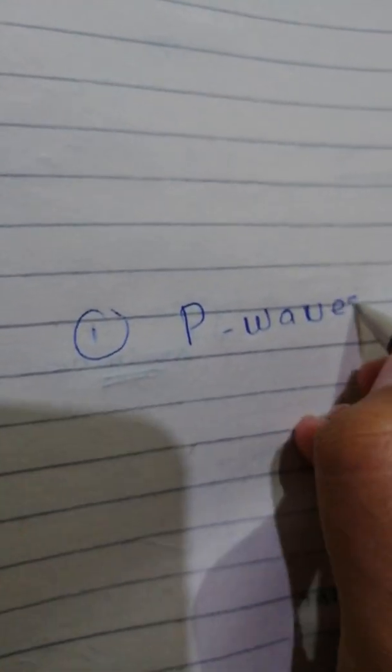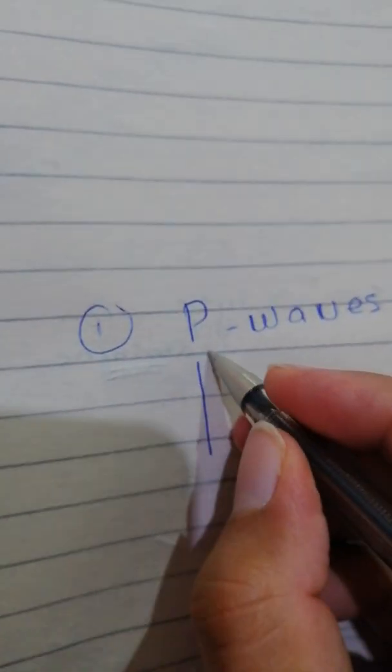Additionally, what you might notice is that the interval between the QRS complexes is variable. All of these are very interesting points, and we will be talking about them right now. So the first question that we can consider is why is there no P wave? Why is there an absence of P waves? The reason for that is that the atria are in fibrillation.